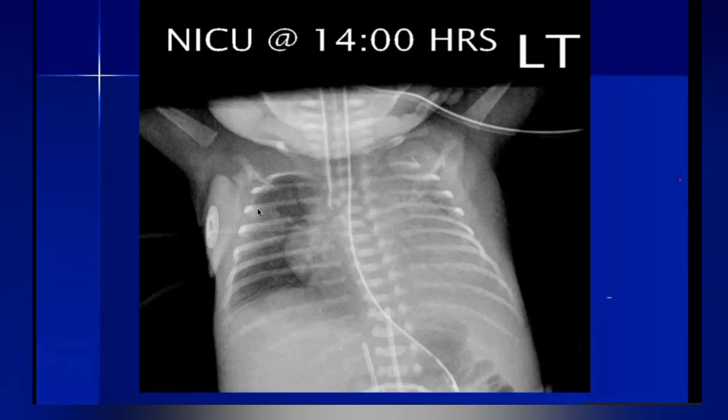It's very clear that the right lung is responding. Some areas are still not responding yet, but the majority of the right lung is fine now, and you can see the cardiac border, but the left lung is still not responding. And this is one of the things that you, as an X-ray interpreter, need to identify. Yes, sir.